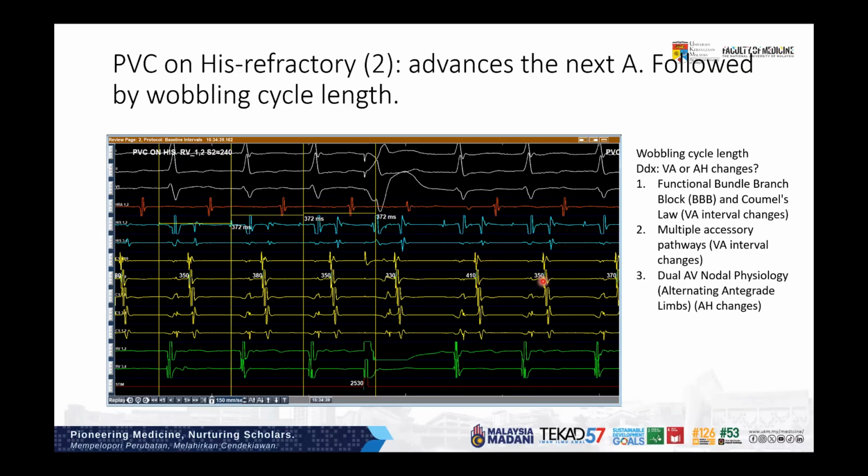That's one potential issue here. Second would be your impulse propagation during the V extra returning. Do you think it's the same when you do V extra, the His proximal timing with the CS proximal timing? I think it didn't change. So it went through the pathway. Yes. So most likely the slow pathway conduction. Okay, you're ruling out a lot of possibilities. If you had a fusion, then your retrograde activation would change the EGM, but it doesn't change. Okay.